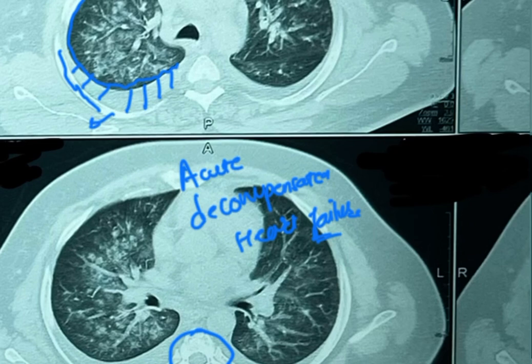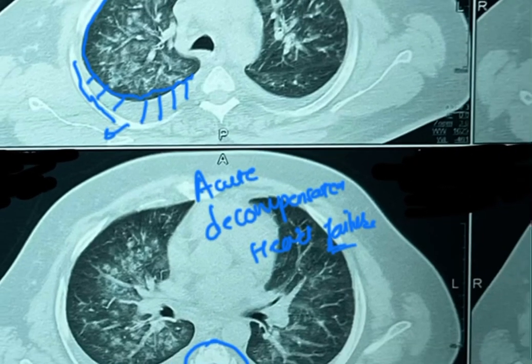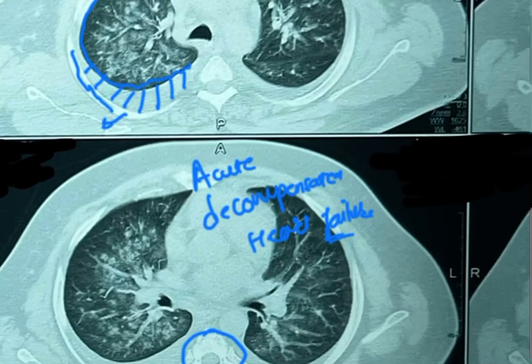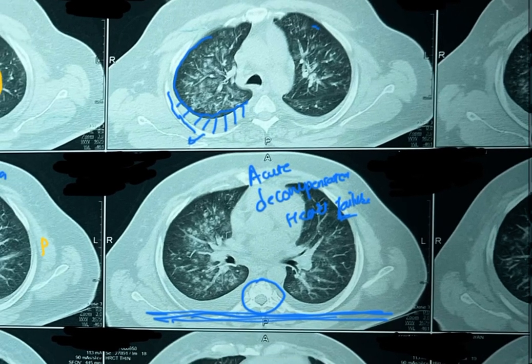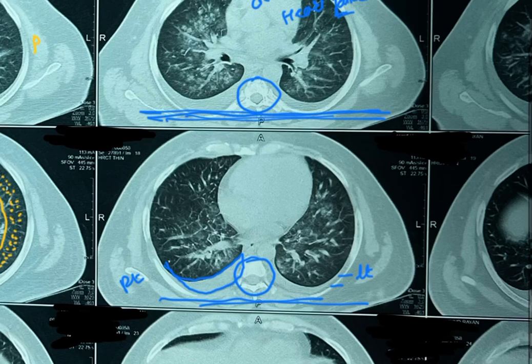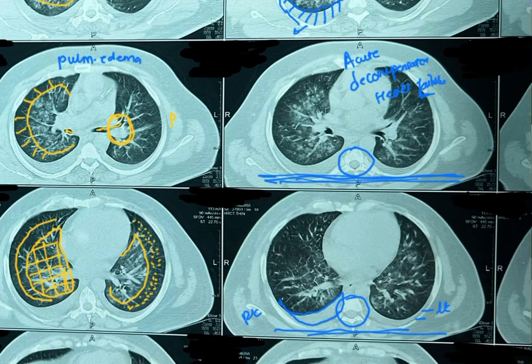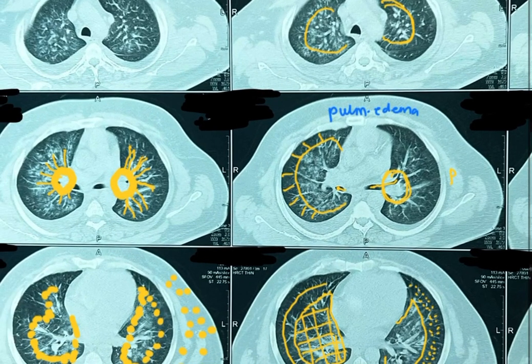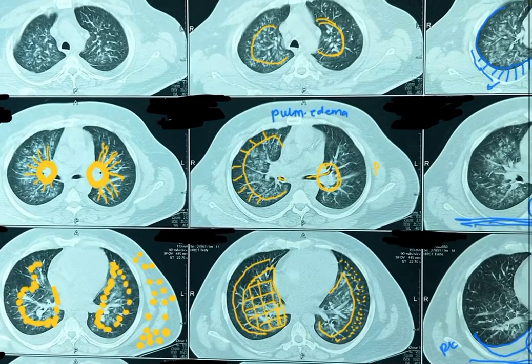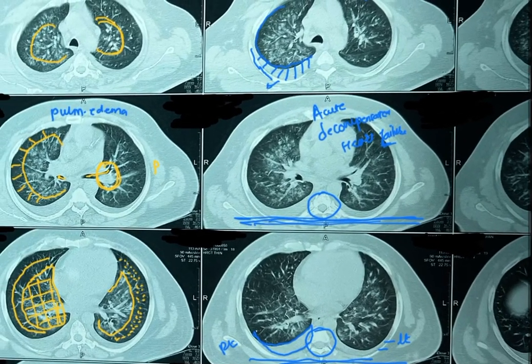So bone will be very much white or hyperdense, air will be black, and the whitish structure, not as dense as bone, and much whiter or kind of radio-opaque structure on CT imaging, is water or pleural fluid. So if this pleural fluid is there, it means there is heart failure. We can also see fissural effusion. What we can try to see is fissural effusion, and we can notice it if it is there, because fissural effusion is one more sign of pleural effusion.